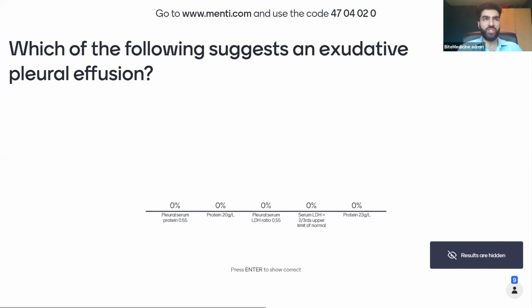I'm just looking at some of the questions on the Q&A, and someone's asked, why put an NG tube in for a pleural effusion? They're talking about the case a few X-rays ago. The NG tube wasn't put in for the pleural effusion. They just happened to have a pleural effusion and an NG tube in. They're two separate things.